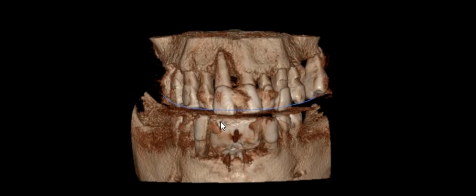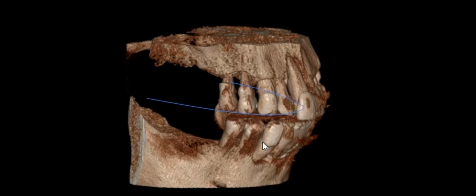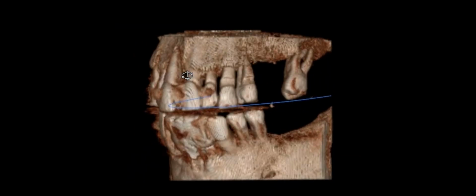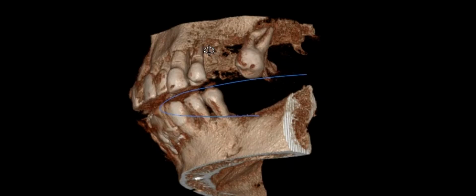Now this X-ray was to prepare for his upper treatment in 2018. And if you look at the upper jaw, failing teeth, gum disease, the bone has been lost and destroyed and damaged by the gum infection down to nearly the tip of the root around some of these teeth here. That's his upper right. Here, the bone has been very much destroyed beyond the tip of the root and just being held by a bit of gum there. And on his left side, again, this tooth here, extremely compromised with the bone significantly lost again down to near the tip of the root.